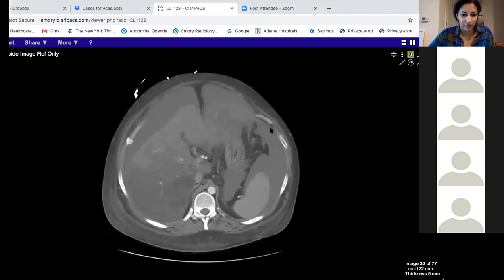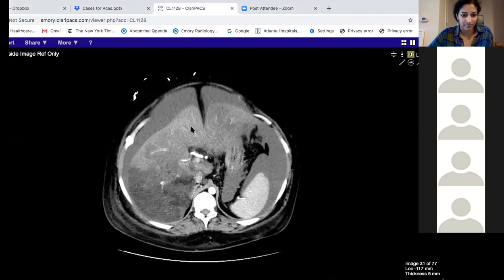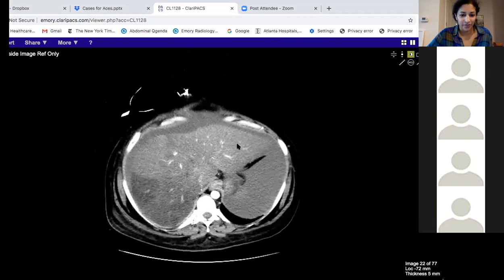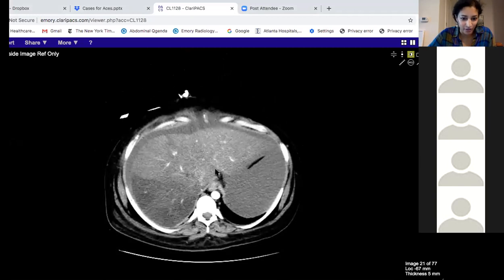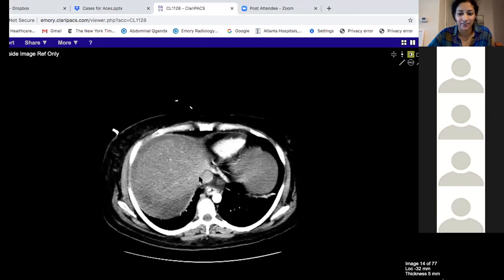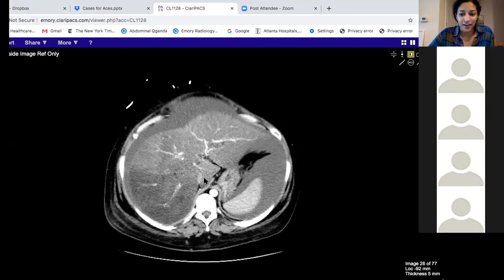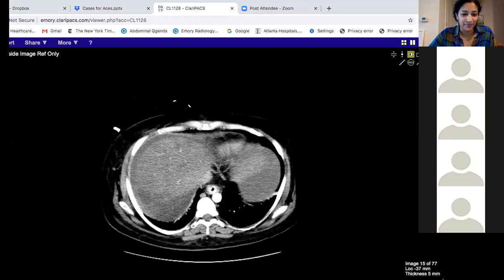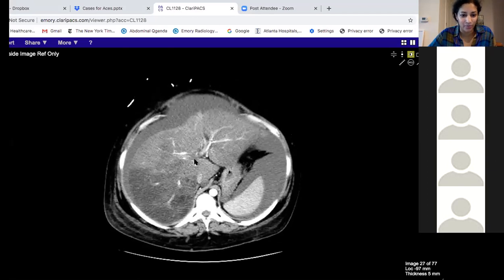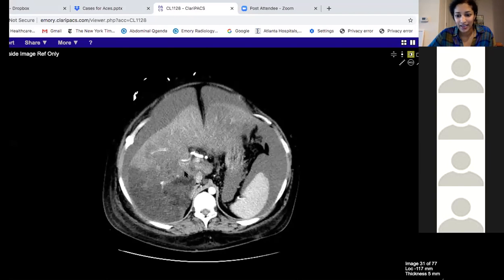Try to narrow the windows. So Anu says she can't see the hepatic veins, so good. I would say maybe you can see a trace of them here, but that was definitely a concern. Budd-Chiari was brought up. We don't have a later phase right now. We can see that the portal vein is probably patent.